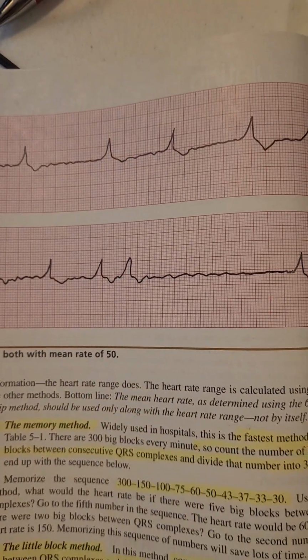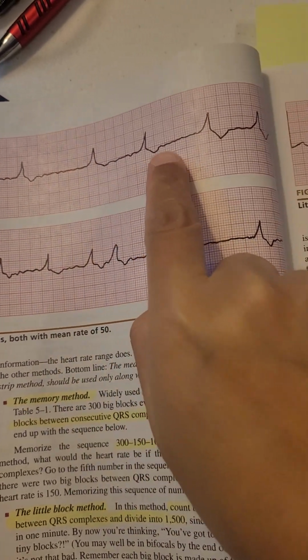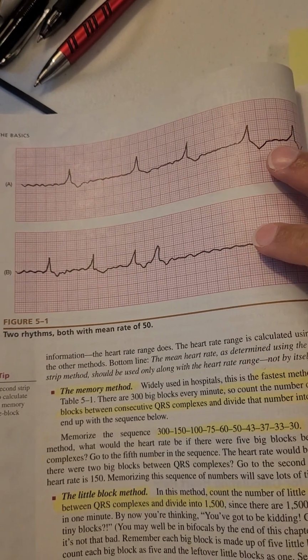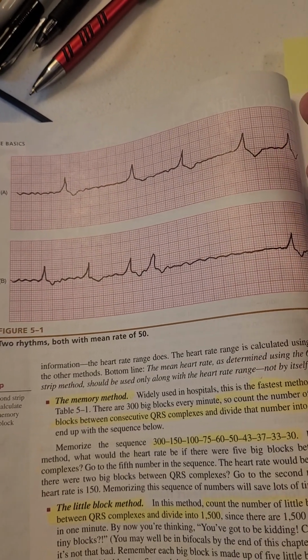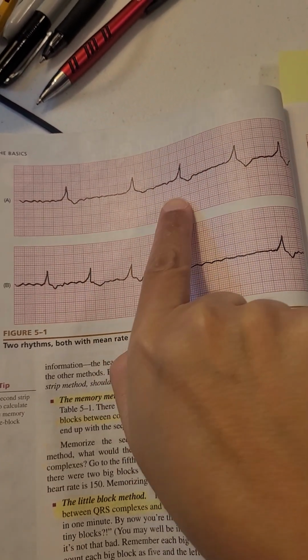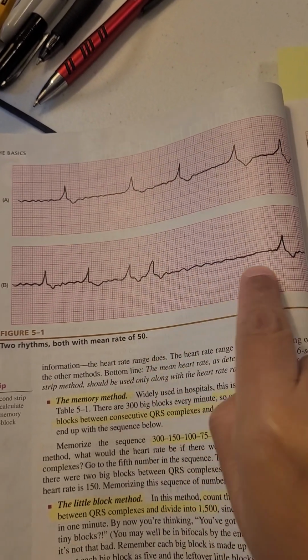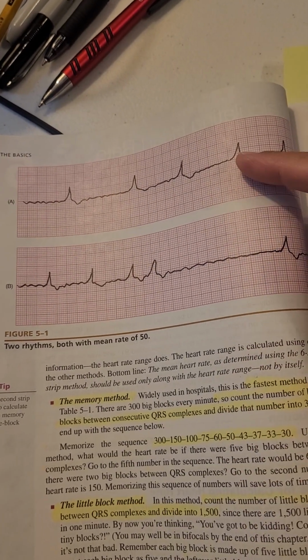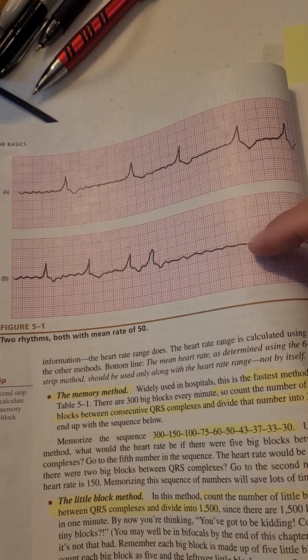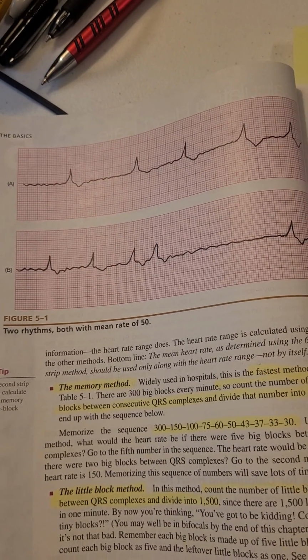And this is an example of what I was talking to you about a little while ago. See, it's 1, 2, 3, 4, 5. 1, 2, 3, 4, 5. So let's pretend it's two different people. This one is probably a little scary, but this one's scarier because it's a whole gap where the heart's not beating. So it could be the same number of heartbeats, the same heart rate, but it's probably not the same. This is probably a little bit dangerous in this one. Just little things to look out for, or to keep in mind.